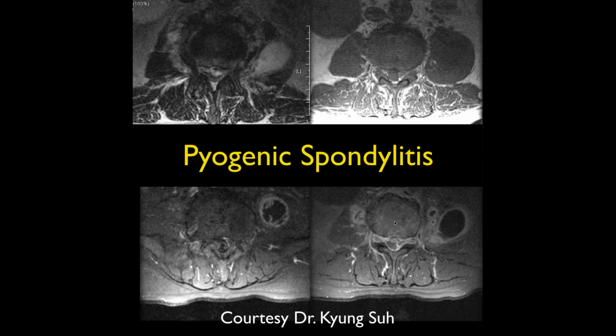But some people believe they can start in the psoas muscles. But here on both sides, this almost certainly started in the end plates and went onto the discs and the surrounding soft tissues.